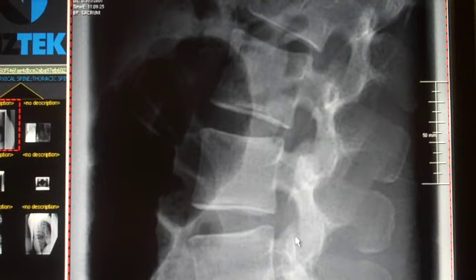And so you see the joint space in front of the inferior articular process right here a little bit, and you see it right there when I point the mouse right there. And so that is the apophyseal joint, but truthfully the superior articular process sort of wraps around the inferior articular process in the lumbar spine. Right here in the middle of the pars area is the transverse process, and if we just stayed on the pars, I would drop down below the transverse process so that I am just on the pars, and then this would be the inferior articular process.